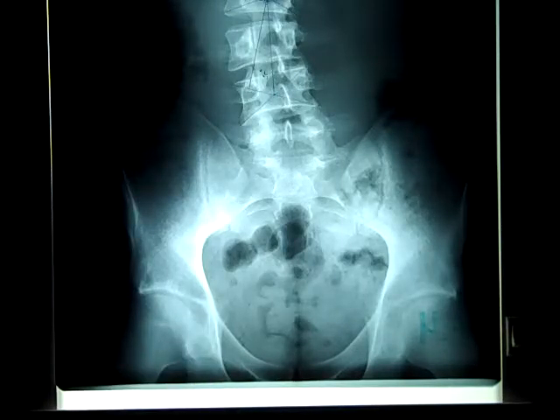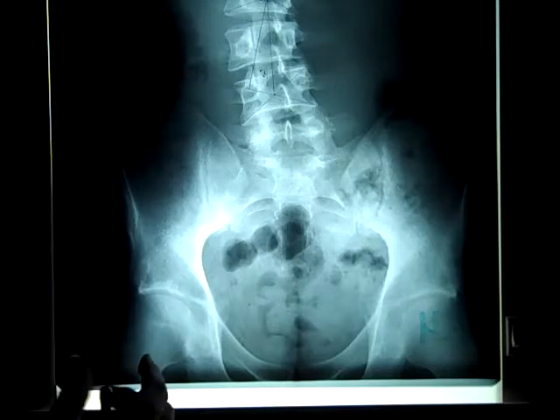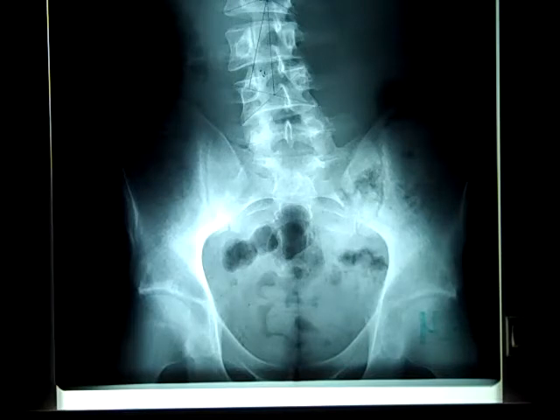This one is a little bit large, and so it would be indicative of something that's causing dissociation, some kind of arthritis or something like that. And so you're looking at that space to see the distance, to see if the femur head is into the acetabulum the correct amount. This concludes page 6 of structural analysis.